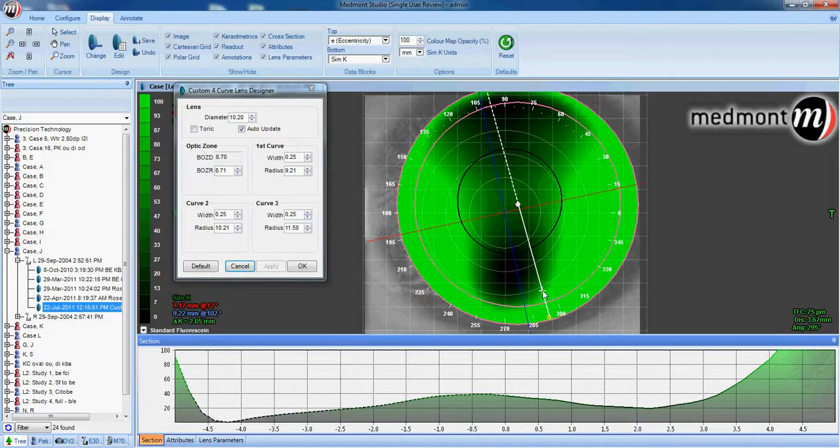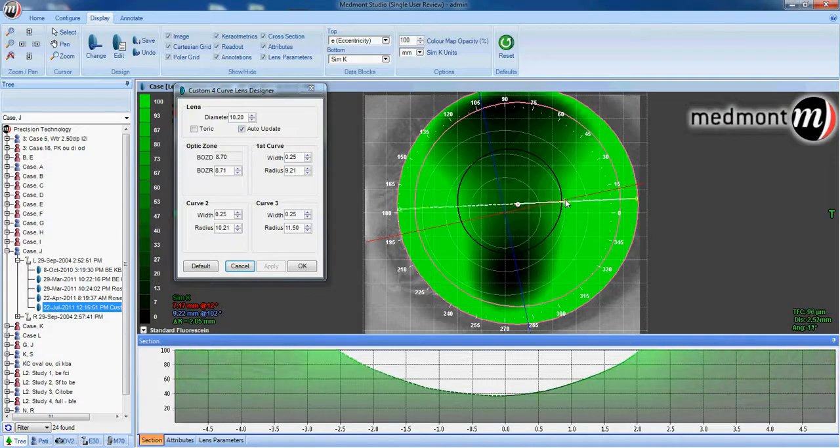Then, which axis has our highest lift? Along the horizontal meridian or steep meridian, we appear to have a significant amount of pooling at 9 o'clock and 3 o'clock. This lens would be horribly unstable across that horizontal meridian with such significant clearance at 3 and 9 o'clock.